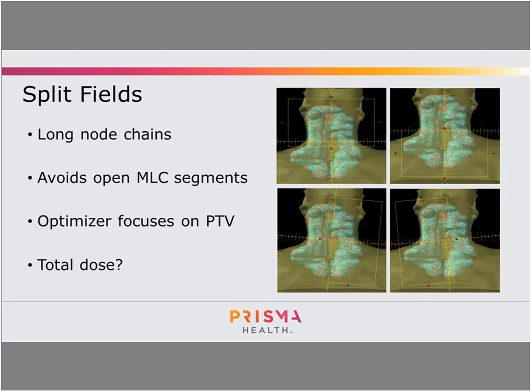So if you do have a patient that cannot lay still, then maybe you can't do it. Maybe you do 3 fields. Maybe you do 2 fields. Maybe you medicate the patient. That would kind of be a physician decision. But for most patients, we are by default doing these 4 fields, and we find that the plan quality does seem to be markedly better.